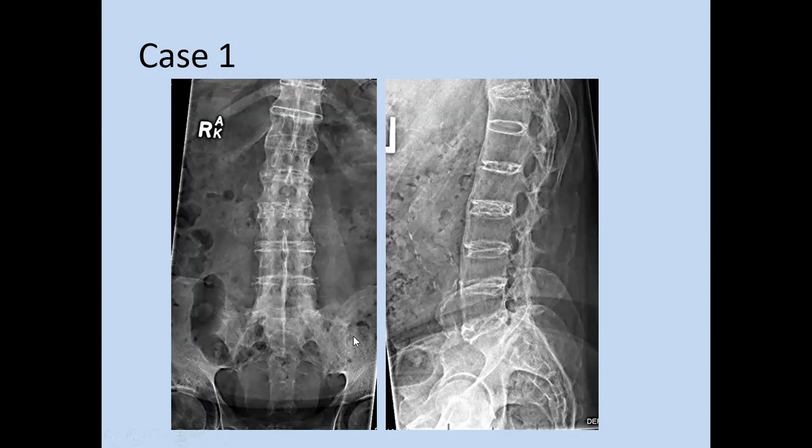I would always suggest having dedicated sacroiliac joint radiographs. But if the sacroiliac joints are obviously very abnormal on the lumbar spine, I do comment on it. So you are right. The sacroiliac joints look abnormal. There's periarticular sclerosis and also joint ankylosis.